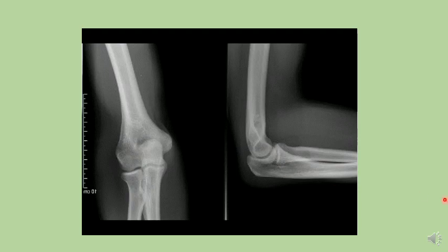Read this radiograph on your own. This is a plain radiograph of elbow. Definitely, we are not able to say which side this belongs to because there is no marked letter here, whether it is R, right, or left. Area of interest is elbow joint, showing lower part of the humerus, upper part of radius and ulna. Both AP view and this is lateral view.